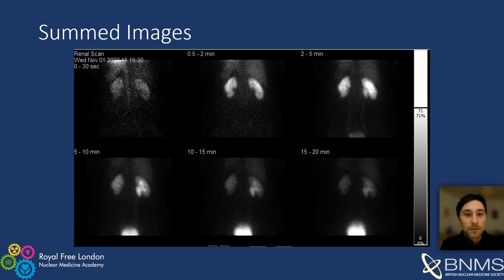The windowing intensity is increased for better visualization. It is important for the images to be properly scaled. If scaled individually, with each image set to its own maximum, it could result in incorrect visual interpretation with regards to how the kidneys are filling and emptying. The upper level of each image is therefore set to the same maximum to show the true image.